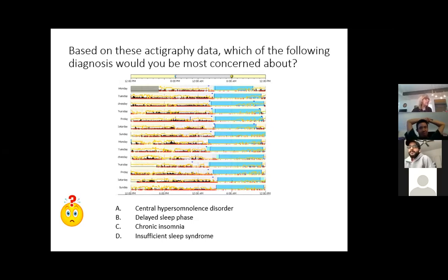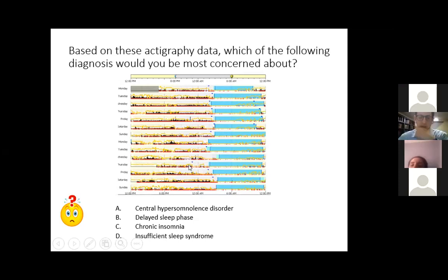And you can see he was pretty good about telling the truth. That's him pushing his event button. And he mostly pushed it when he got out of bed. Everybody good with that? Here he got into bed a little earlier, but there was so much waking, I didn't move him over here. He might have been watching TV or who knows. I mean, there's some judgment here. I could have argued to put it here, and then he would have had reduced sleep efficiency.